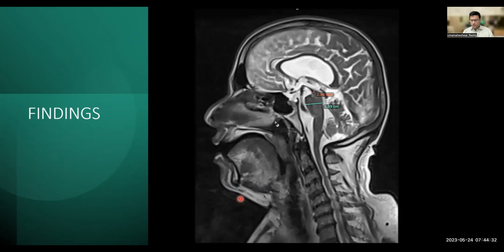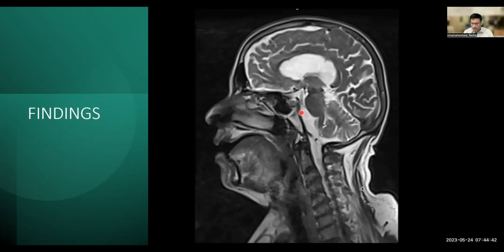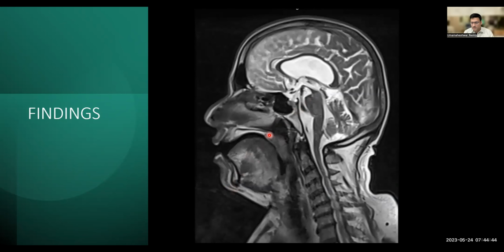Again, in the sagittal view is the most obvious finding, where there was clear atrophy of the midbrain. I'm just removing the drawings to clearly create a visual impression of the pathology. This is the typical narrowing which you are appreciating. There are also some spondylitic changes. At this point, what's your diagnosis?